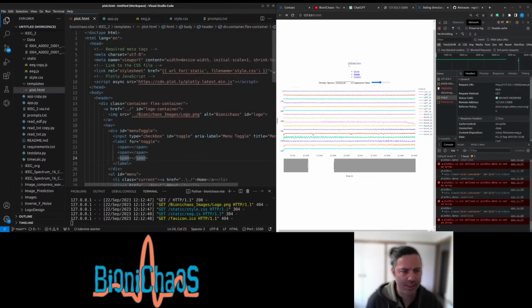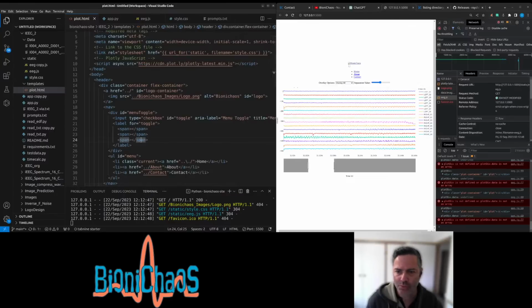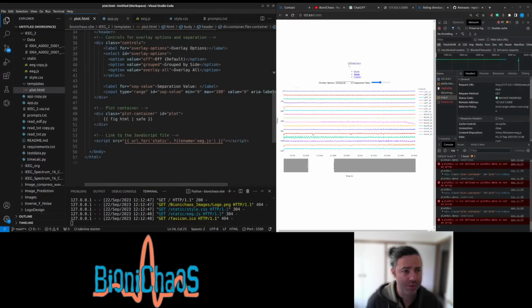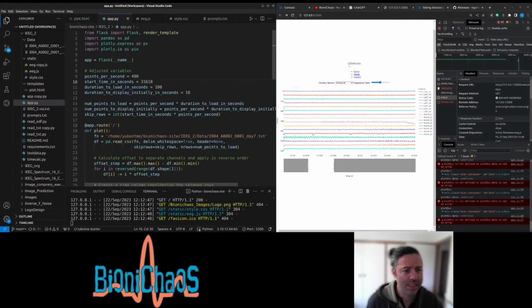We have this HTML. Sorry, my logos don't work. We'll fix them later. It's really just loading this Flask application. The IEEG.org has a scroller player web application as well. Similar, different. We'll just do our own and try to do better. I don't think it will be very hard. Theirs was also developed quite some time ago.